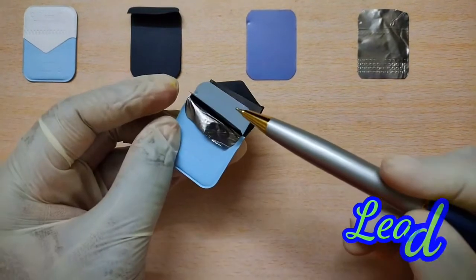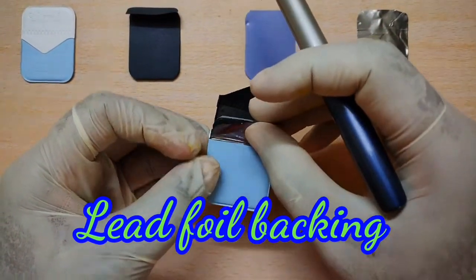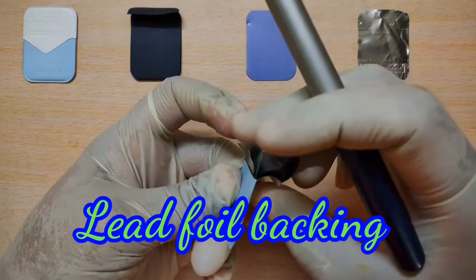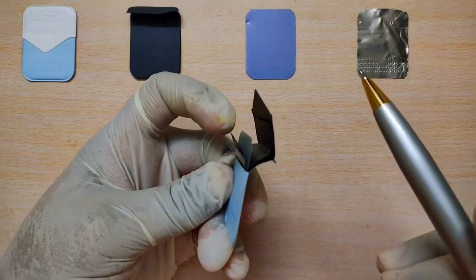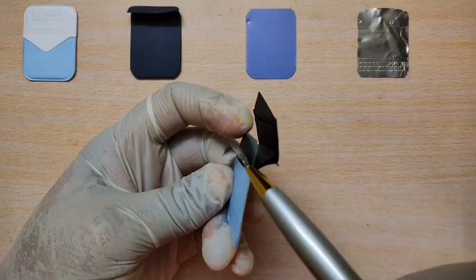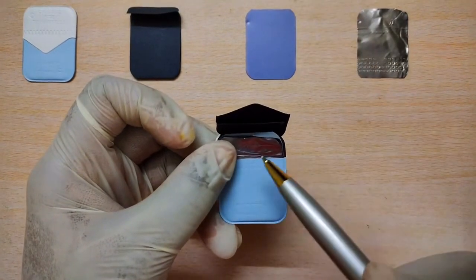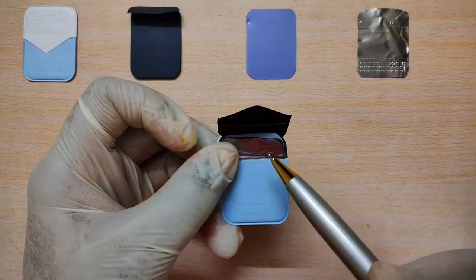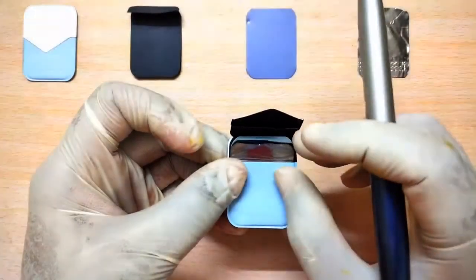The fourth component is a thin lead foil backing with an embossed pattern that is placed in the film packet behind the black wrapper away from the tube. This lead foil backing shields the film from backscattering, that is the secondary radiation, which fogs the film and reduces the contrast, affecting the image quality. It also reduces the patient exposure by absorbing some amount of the residual beam.